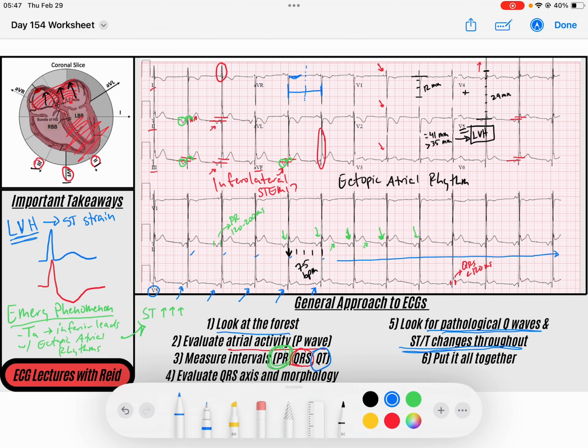So this is an incredibly difficult ECG to assess for ischemia. And I would say that if you were to assess for ischemia in this patient, you would need to really utilize the clinical picture, right? If this is a young 18-year-old athlete, maybe you're thinking this person has a hypertrophic cardiomyopathy type picture with the hypertrophy.